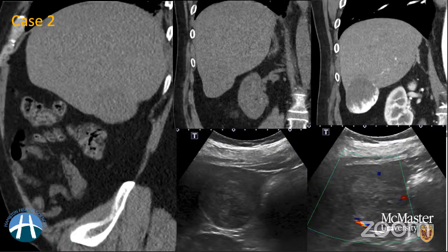This is a hemangioma. So again, this is something which I always tell anyone who is reading ultrasounds in a cancer hospital. When you know that your population is probably going to have cancer, whenever you see a new echogenic lesion in the liver, always try to give your differentials. You cannot be 100% certain that this is benign or malignant, but always include your differentials, that it could be these things on the benign spectrum and these things on the malignant spectrum. I have seen a couple of cases when a new echogenic lesion was labeled as hemangiomas.